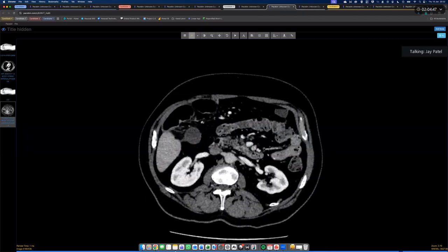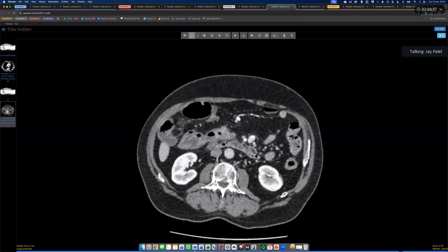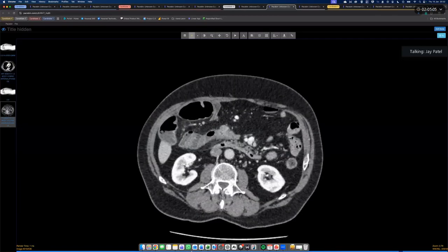Now, one thing colorectal cancers do is enhance. On a portal venous phase study, they nearly always slightly hyper-enhance compared to the adjacent bowel. Spasm doesn't do that. Cancers do. There are broadly two types of cancers that you see.